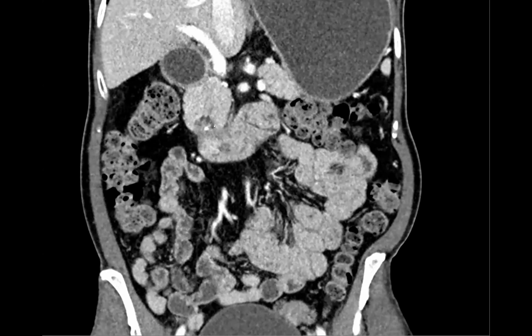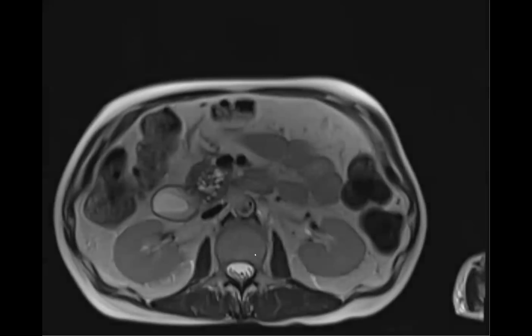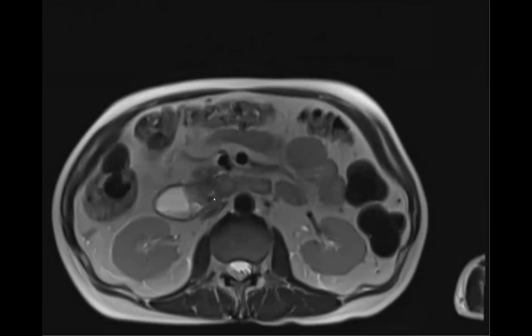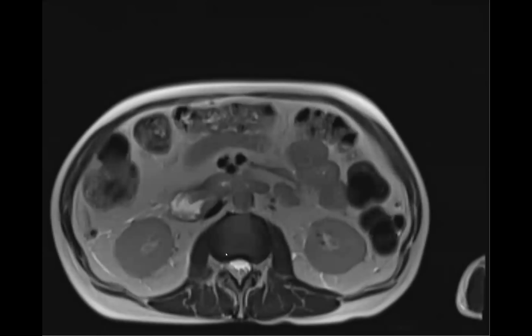And then three, I just thought this was a beautiful mimic of a serous adenoma, but it was actually the corona sign of dilated ducts in the setting of an adjacent cancer. And here it is. If you look at it now, to me, this all looked like apple core, so I was favoring duodenal. But it was just, like you were saying, serosal, coming from the outside, narrowing the lumen and actually arising from the low uncinate process of the pancreas.